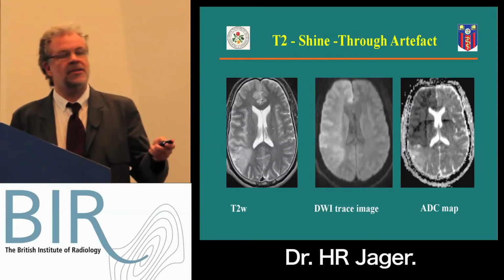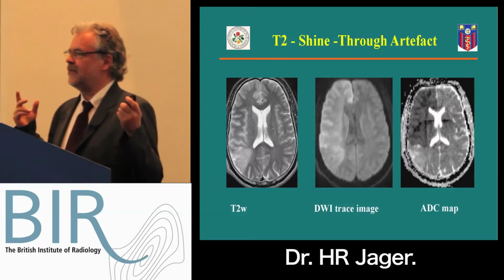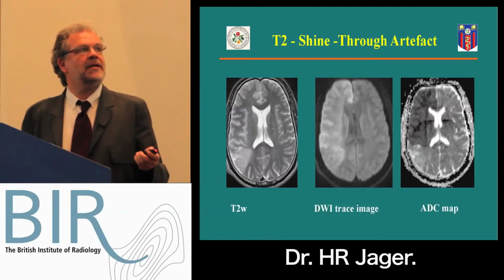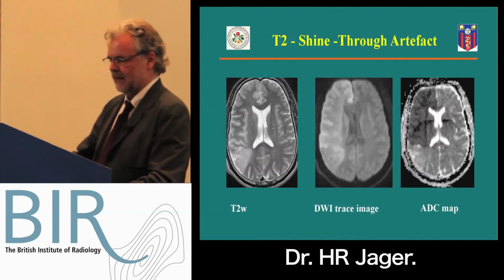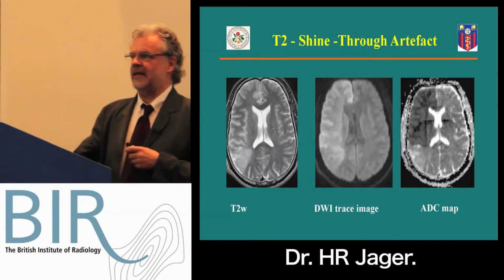So this image just highlights the message that the diffusion weighted image, or in proper terms the trace weighted image, is a combination of T2 and water effects. You may be familiar with the T2 shine-through effect, but are you familiar with the T2 masking effect?